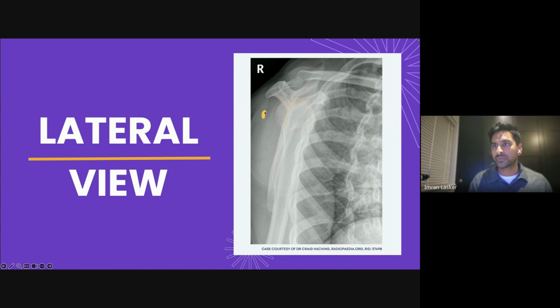or that the humeral head is facing towards that Y, because sometimes you don't get quite a lateral view. Patients aren't perfect. They move in the middle of the scan. They don't quite stay still. You don't get a perfect image. So sometimes you see the humeral head sitting like this, but it's still overlapping slightly or pointing towards the center of that Y.